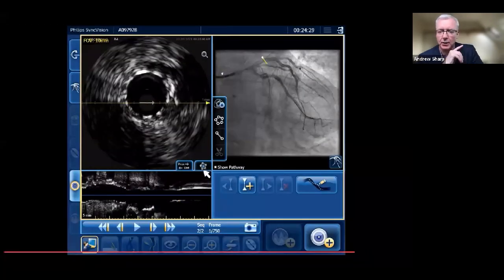So here's the old LAD stent from 8 years ago, and it's actually not bad. I mean, considering it wasn't an IVUS guided PCI, we think, otherwise they would have seen that left main problem. We've got a 3 by 3.3 millimeter lumen. There's very little neo-intima.